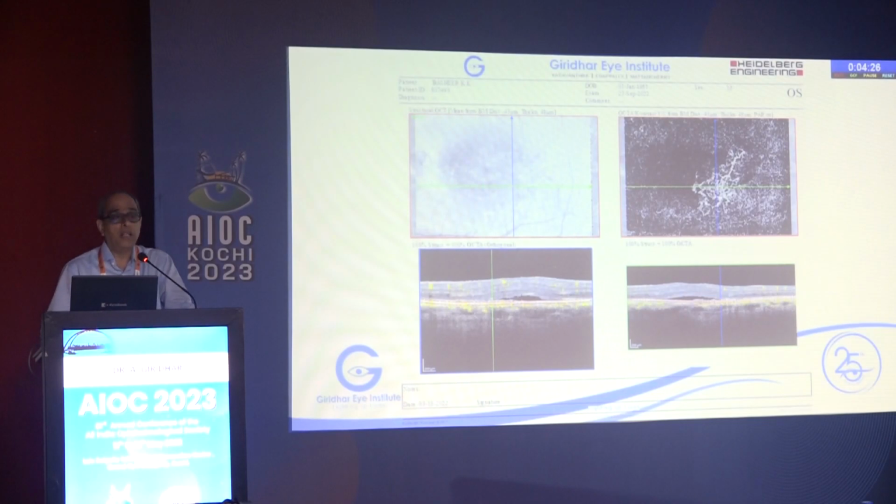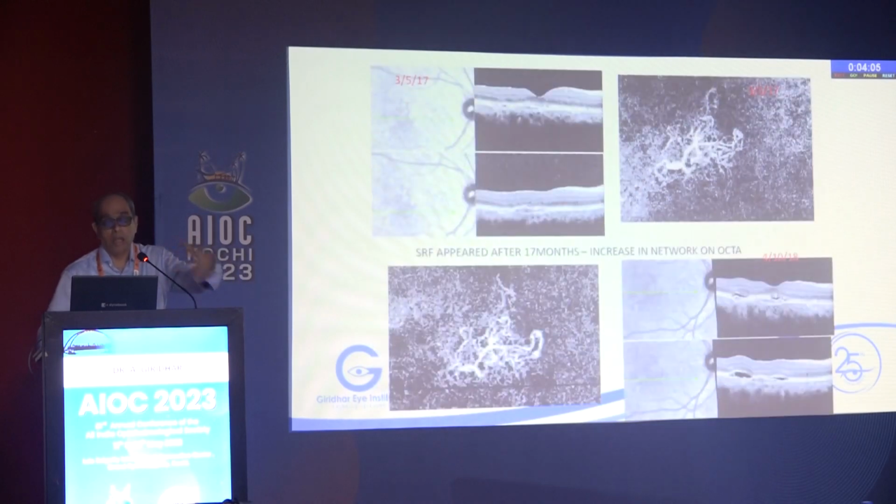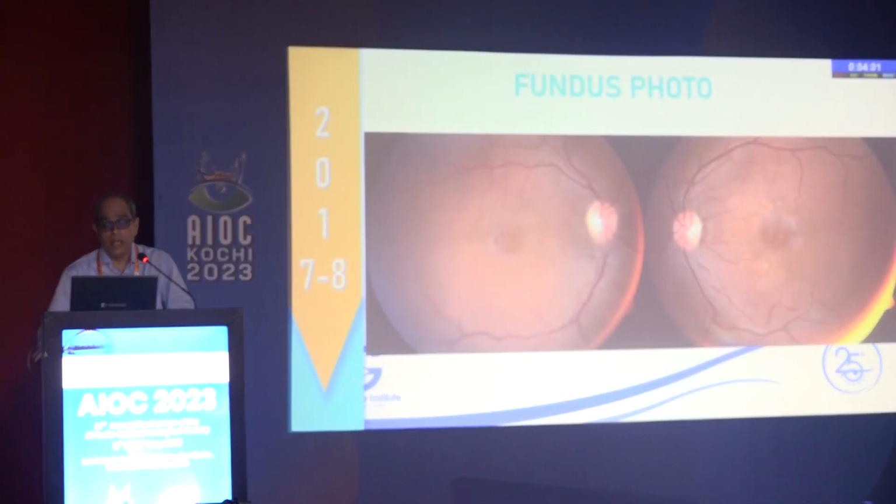But then finally we did an OCTA because we thought that it could be a CNVM because the patient is old. So OCTA shows a neovascular network. So in elderly patients, we use multimodal imaging like this. Although the other tests were not conclusive, we do the OCTA. Nowadays we do it early. But what I mean to say is the stepwise use of multimodal imaging in this setting.